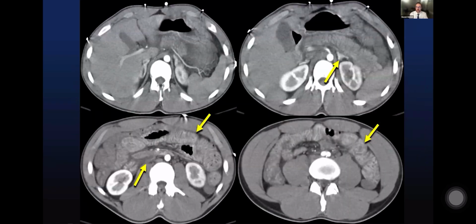Here's a patient with hypoperfusion complex. Notice the hyper enhancing adrenal glands, the flattened inferior vena cava, and the marked increased attenuation of the small bowel that's enhancing more than muscle. Again, so-called white attenuation of spastic reflex ileus in this patient with hypoperfusion complex.